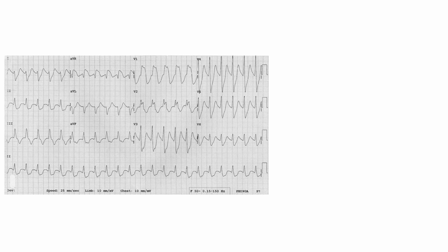So there's two things we should think about here. There is TCA intoxication and there is hyperkalemia. And TCA intoxication usually has a really dominant R wave here. So this probably is TCA intoxication. The easier way of doing it is just take a potassium. If the potassium is normal, then it's a TCA.